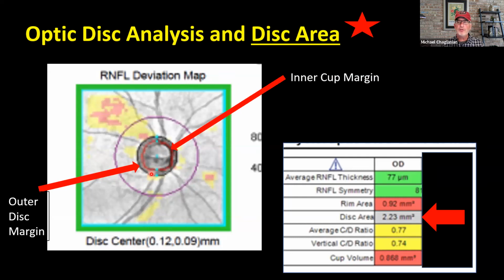But when you're examining the disc ophthalmoscopically, I'm trying to encourage people to make sure you're still looking in the back of the eye. This diagram here, not the metric, so a little bit different from what you asked me, sometimes can help my students identify where a notch is, where the disc margin is, things like that. But again, it's soft, no doubt.